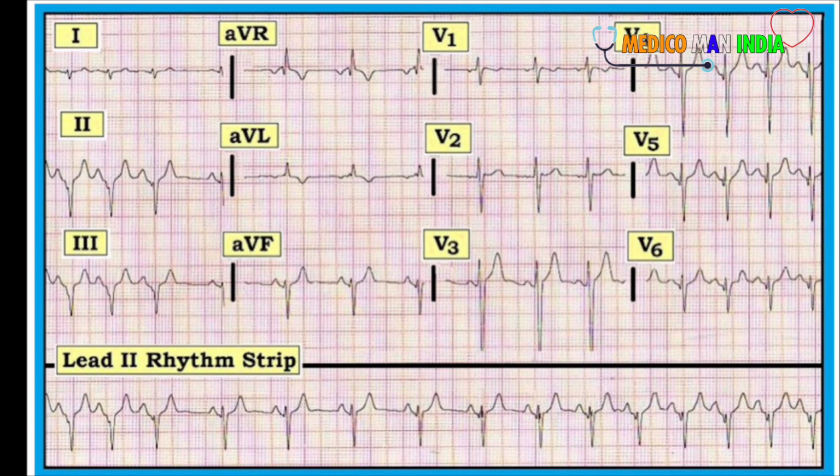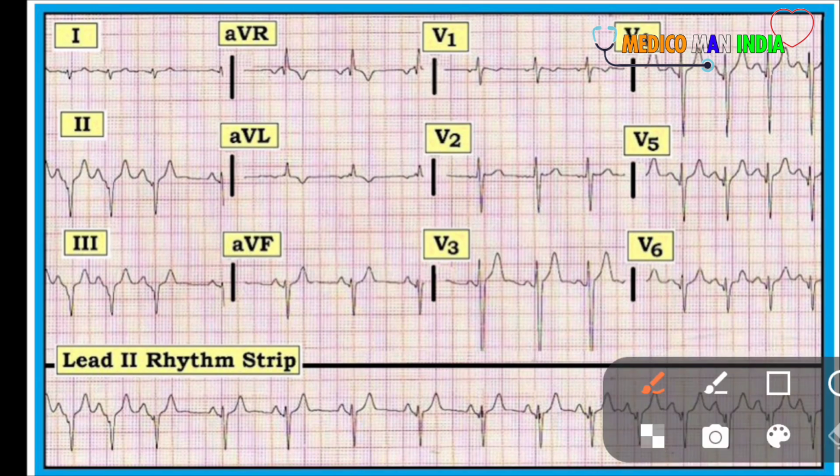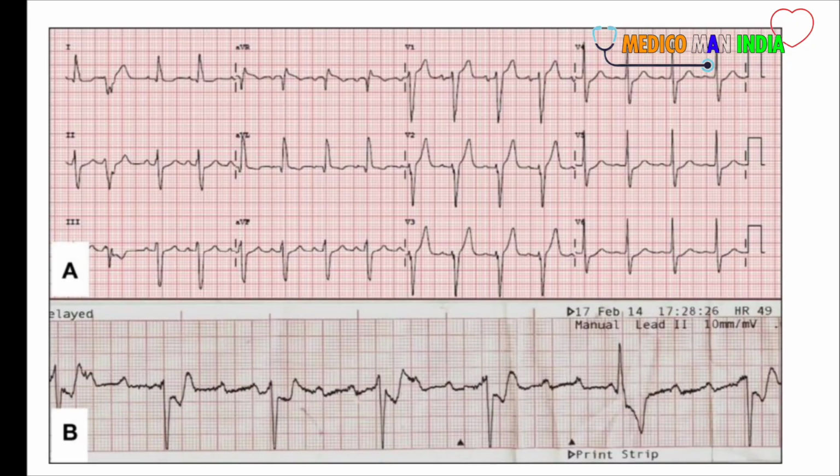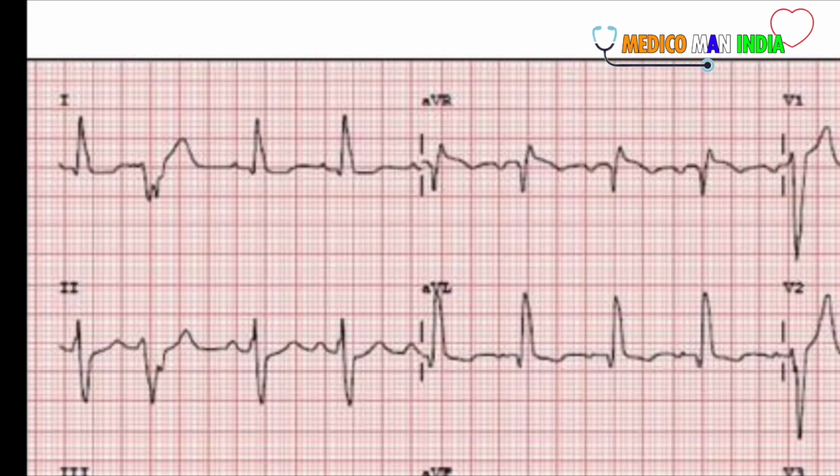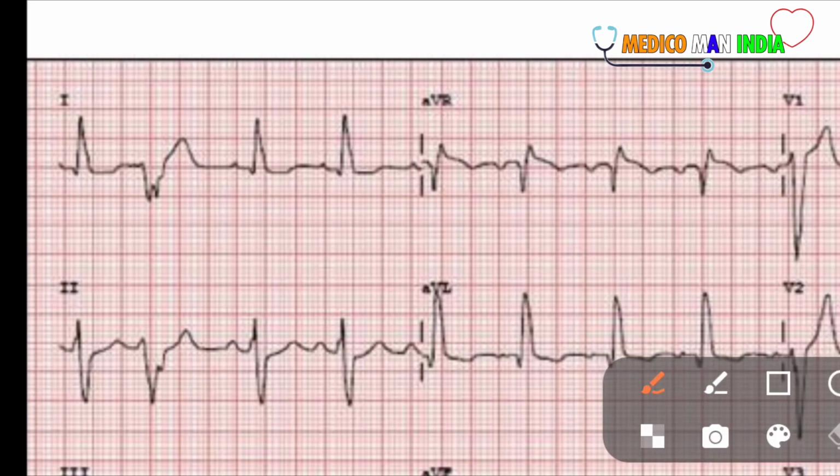So for cardiac axis, you are seeing lead 1, that is here, and you are seeing AVF. These two leads are used for cardiac axis. In that we are going to do R minus S, where R is the height of the R wave and S is the depth. This is Q, this is R, and here S. And this is the isoelectric baseline.